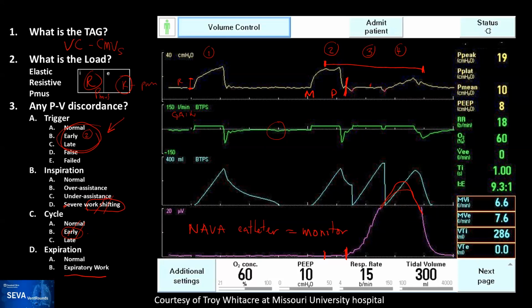True. Thank you, Rob. And this is certainly a very large effort. If you just count, each one of these spikes down here is a second. So the inspiration for this patient, if I assume that it ends around here, where I still see evidence of effort. Sorry, I was slouching, and that sabotages me. So 1 second, 2 seconds, 2.5 seconds of inspiration. So this is kind of a yawn or something. It's a very large respiratory effort. And so there you go.